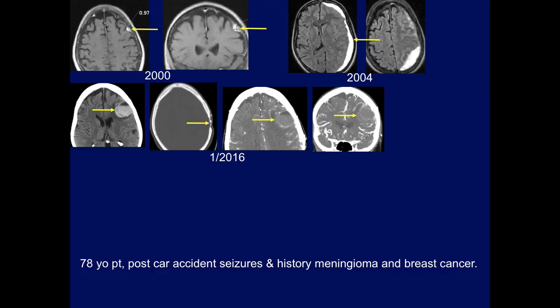Now, as we have a little time, I wanted to go into this case, the issue again of bleeding meningiomas. Again, this is a case that in January I went over with Eric, who brought this to my attention, and then again Gino and I talked about it this weekend because of the follow-up. So this patient in 2000 had this tiny meningioma overlying the left convexity. Some of this history and some of the images showed up later.